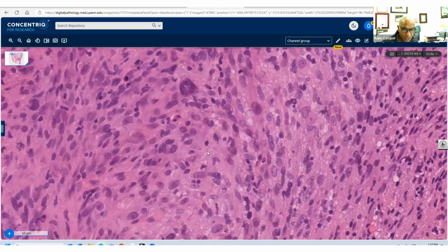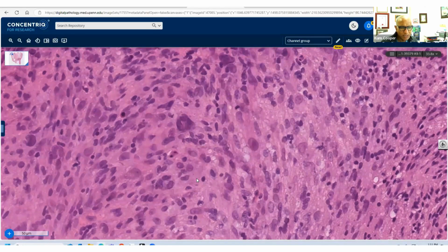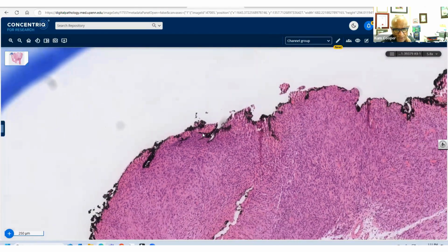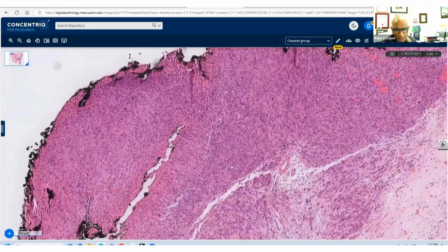Okay. Histiocytic was mentioned. I'll mention that the histiocytic markers are both negative. So I'm not going to go through the CD68 or CD163 unless you ask me what those are, and we can talk about it. But the histiocytic markers are negative. So we're left really with S100, SOX10 diffusely positive, clearly malignant because of the nuclear pleomorphism and the depth of invasion as well. And you can see this is behaving pretty aggressively here.